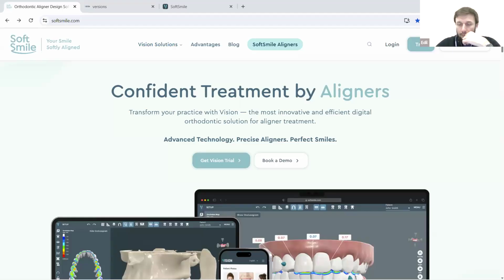So currently, as you know, you can move the blockouts, the interproximal, interdental blockouts, around and you can scale them. So that functionality is already available. You can apply it to all aligners, or you can do it individually between a pair of teeth. If you can elaborate on what controls you're talking about, maybe you're missing something that we already have, or maybe it's something in development.